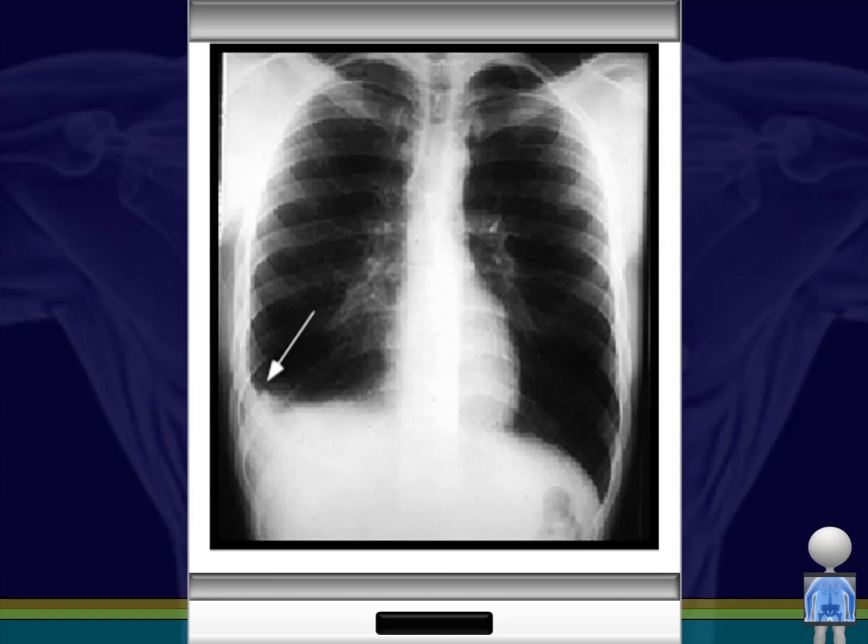And the way a pleural effusion looks here specifically is number one, looking at that blunting of the costophrenic angle. Now again, pneumonia in the lower lobes can cause blunting as well, especially in the very beginning. But in this case specifically, we have loss of our costophrenic angle on the right side, and we have this nice opacity showing pleural effusion fluid.